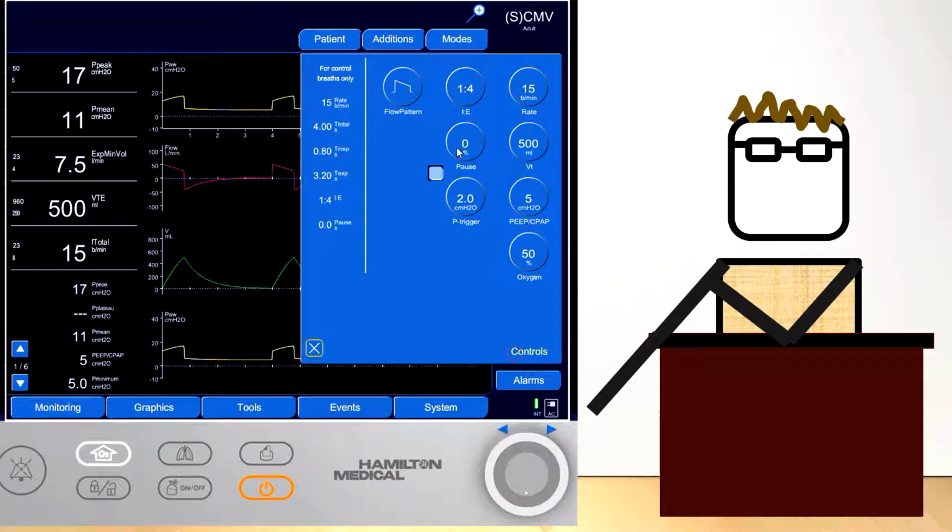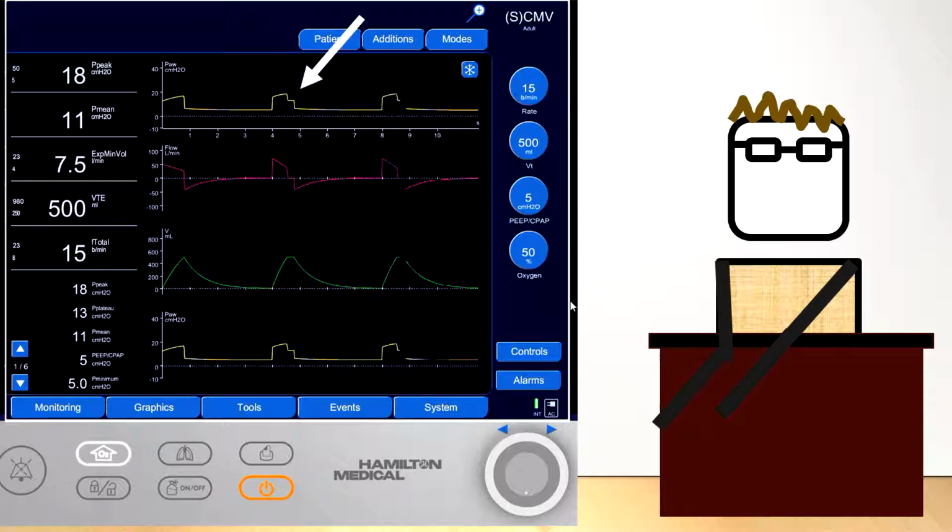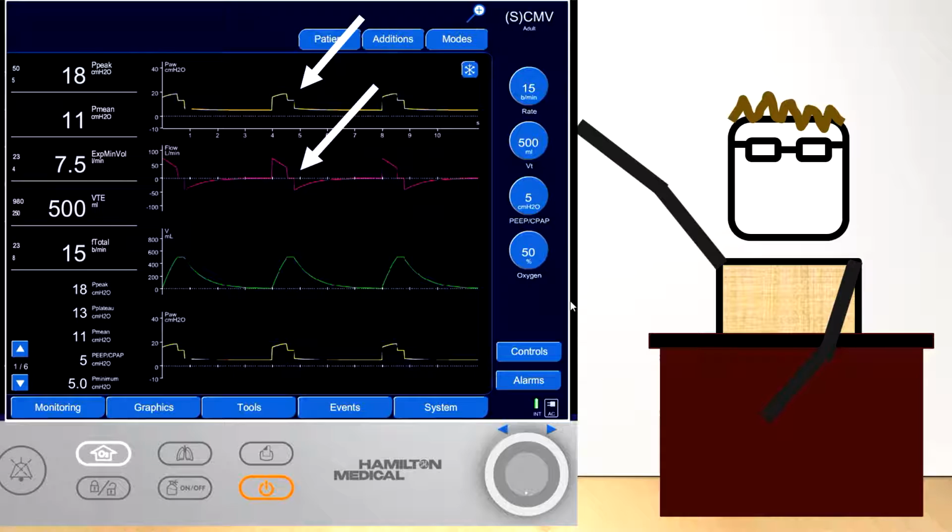Occasionally, the ventilator can be set to have a longer inspiratory time than the time necessary to deliver the entire tidal volume breath. On the pressure waveform, you would then actually also see the plateau pressure, as the airflow is zero during that time period.